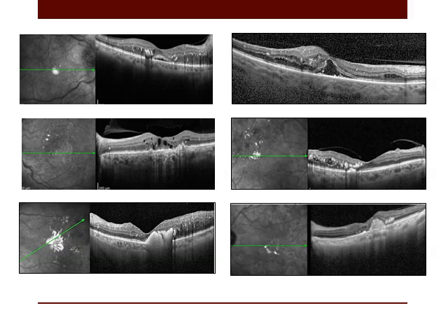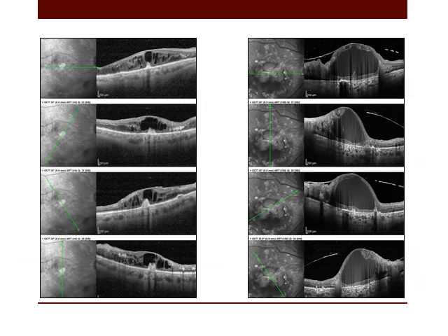The presence of foveal hard exudate carries less favorable prognosis than usual. And also the presence of foveal plaques. By plaques we mean the disruption of the outer retinal layer and replacement of them with the foveal hard exudation. Carries bad prognosis. Disruption of the integrity of the retinal architecture carries bad prognosis. Presence of large degenerative cyst: even if the cyst flattens with injection, the vision will not be much restored.